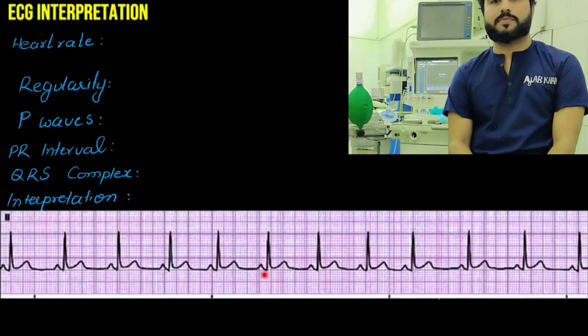Now, what you should do is pause this video, take a piece of paper and solve these ECGs yourself, because till the time you don't solve these ECGs yourself, you won't remember anything. ECG is a very volatile subject.